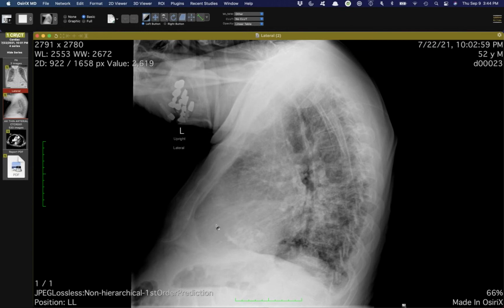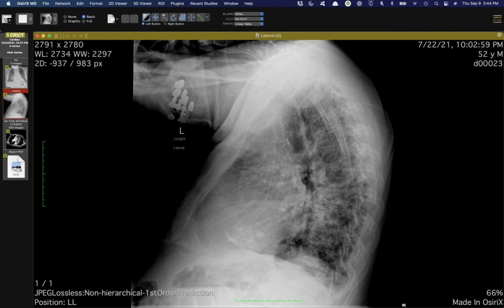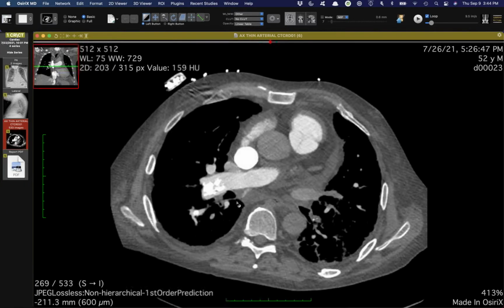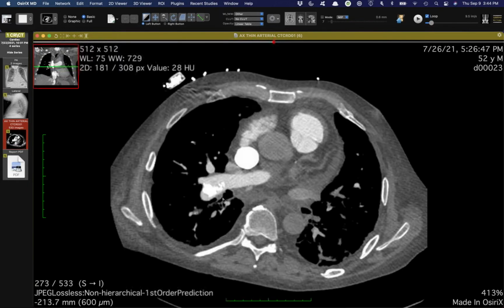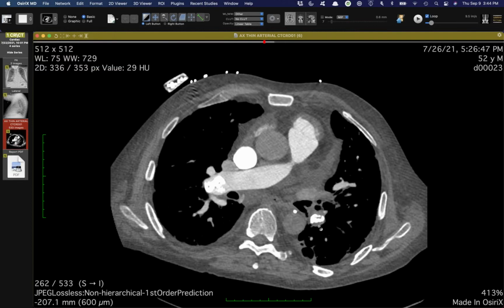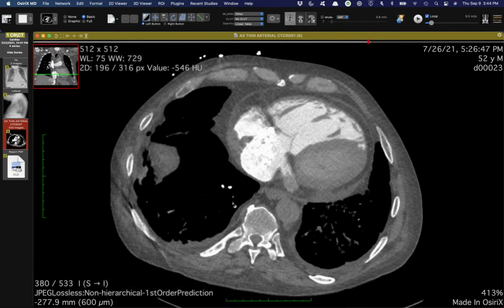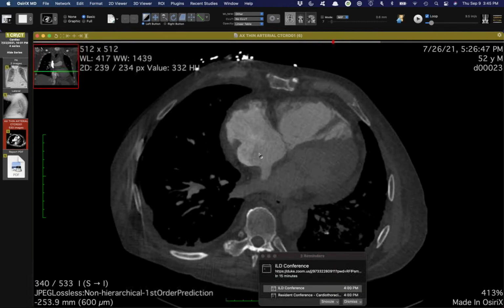And there's also something here, as I will show you on the CT, some calcification in his heart. This is not the same thing that Howard showed, but this was actually visible on the radiograph as well. It's easily mistaken for just calcified granulomatous lymph nodes. But this patient, you can see this is chronic calcified stuff in the left lower lobe. This patient was actually referred to our CTEPH clinic here. You can see the same thing there. And then this was the big honking thing in the right atrium.